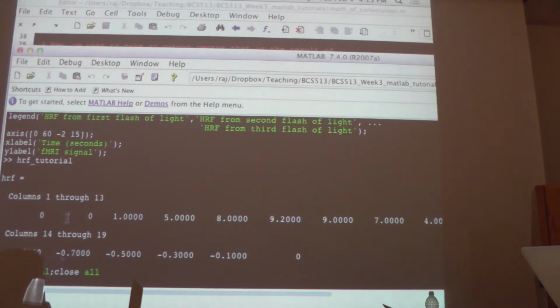They're saying, if I think that my voxels respond to this stimulus to this degree, then I ought to expect this kind of MRI response to them. So what you do is you make these predictors, regressors, for each of your different stimulus conditions. In this particular case, I just had one condition, a light. What if I have two conditions? I have a light and a sound or something like that. And we're going to look at that now.